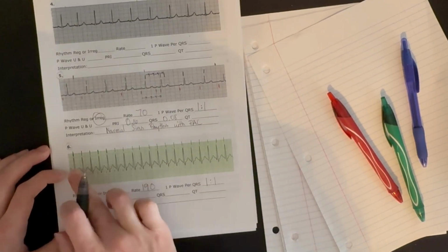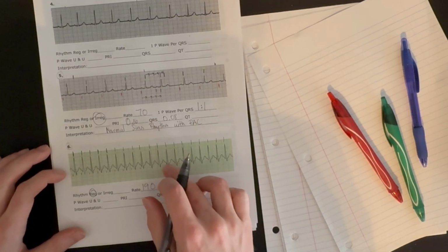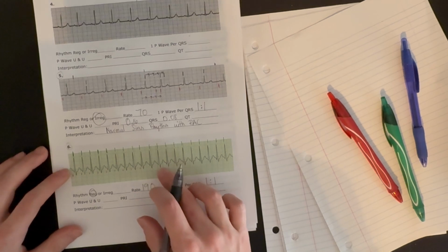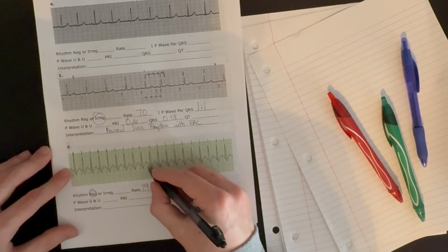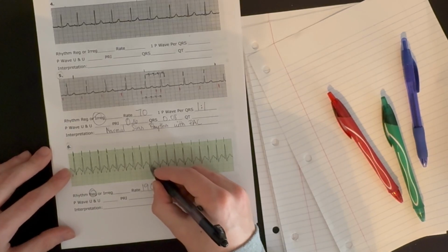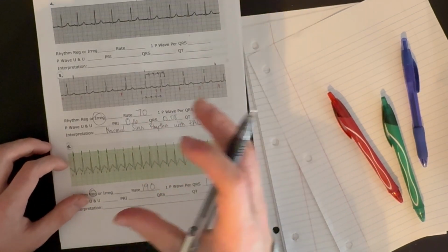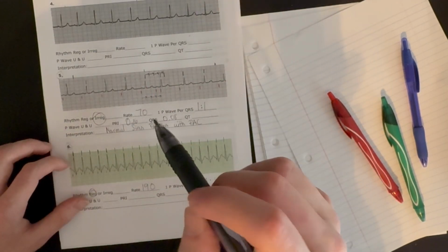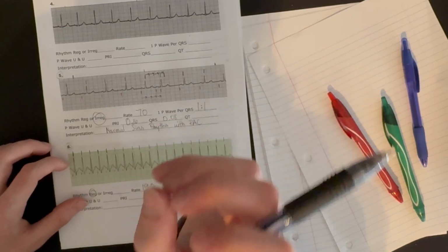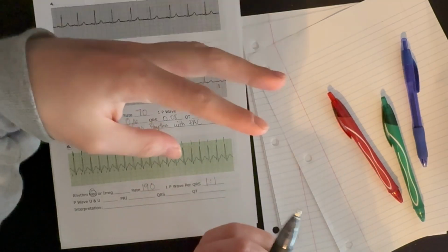So that tells us that this tachycardia is originating from above the ventricles. We do still have atrial contraction before each QRS complex. And we also see that if we look at our P wave, or what we can see of it, it is a bit of an upward deflection. And so that at least tells us that it's likely coming from somewhere in the atria. Because if it was an upside down deflection, that means the atria would be getting depolarized from the bottom up instead of from the top down.